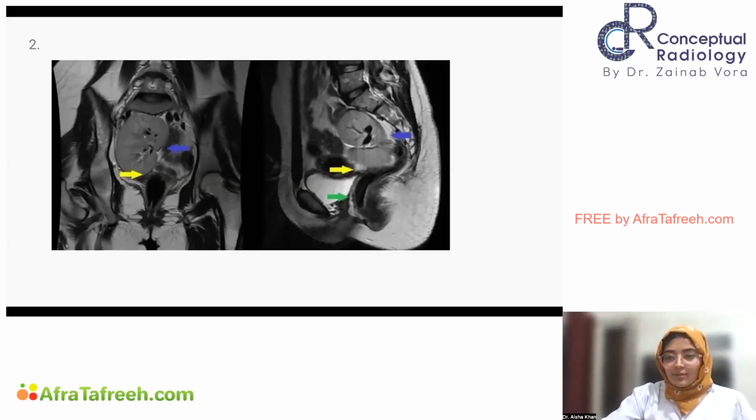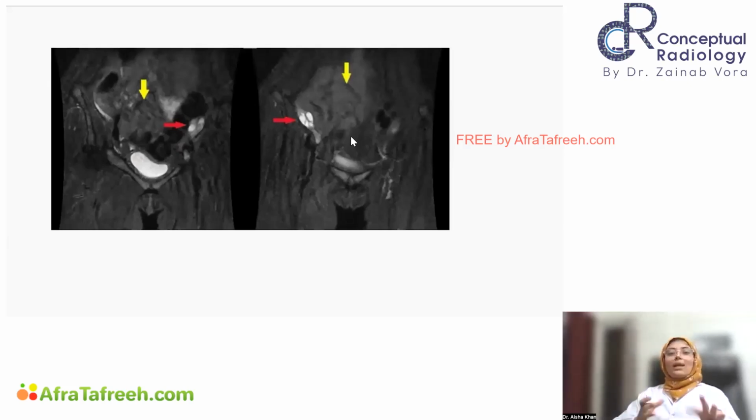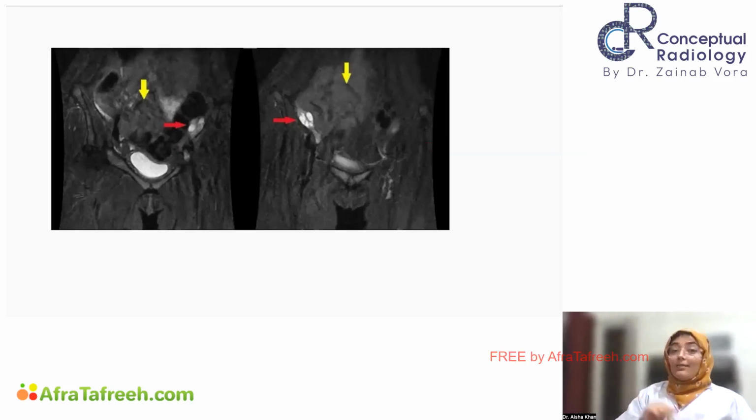And in the STIR image also, what we see here is the two ovaries on both sides, right and left, which are normal. Because in MRKH syndrome, the ovaries, the gonads, come from the genital ridge, so they will be present. Morphologically they will be normal, even functionally they are a little suboptimal, but morphologically the two ovaries are normal. What we don't find is the Mullerian duct structures, that means uterus, tubes, all of that were absent, and a pelvic kidney was present.